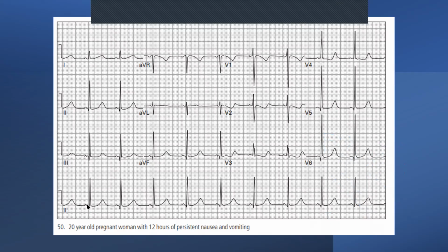So if you look, we've got 1, 2, 2.5 to almost 3. So we've got a normal P wave and PR interval. We've got narrow QRS complexes. We've got a QRS following every P, and we've got them coming in relatively regular intervals. All right. So again, if anybody's lost, just go back and watch that video.